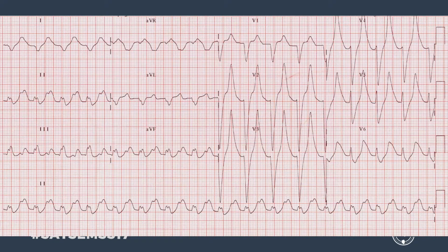Because we have a tendency of the P waves to flatten and the excitability of the atria to go down, the interval of the QRS complexes can become prolonged. What naturally follows when the heart doesn't get impulses from the atria is an active escape rhythm. This can be either from the AV node or from the ventricles themselves, and quite naturally we will get different appearances depending on if we have a junctional escape rhythm or a ventricular escape rhythm.